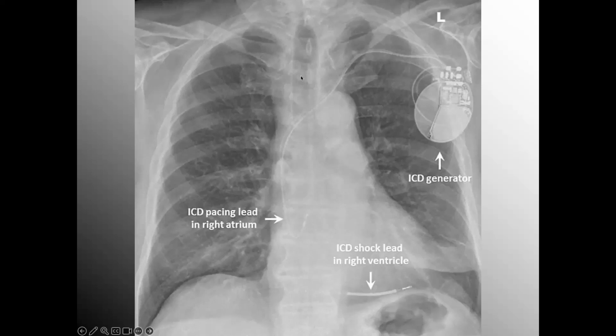So if I start with my airway, it looks to be midline. I mean, it doesn't have to be perfect. It's not significantly offset. You could argue slightly towards the right, but I feel that may be positional. Now, we've cut off the costophrenic sulcus on the right side, and you'll get that occasionally where the film is not adequate, and sometimes an ordering provider will say, well, we need to reshoot it, or they'll just make a decision based on what they have.